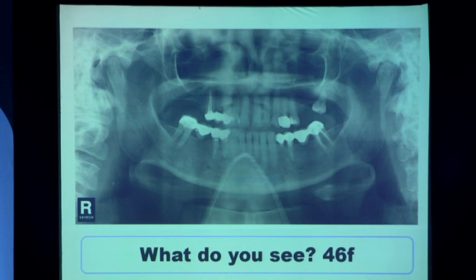Absolutely asymptomatic, but the only thing is she's not able to open the mouth. Okay, fantastic. Hyoid bone is curved. What else? I gave you the clue. I told you the patient is not able to open the mouth. What can cause the limited mouth opening, or what can prevent the patient from opening the mouth?